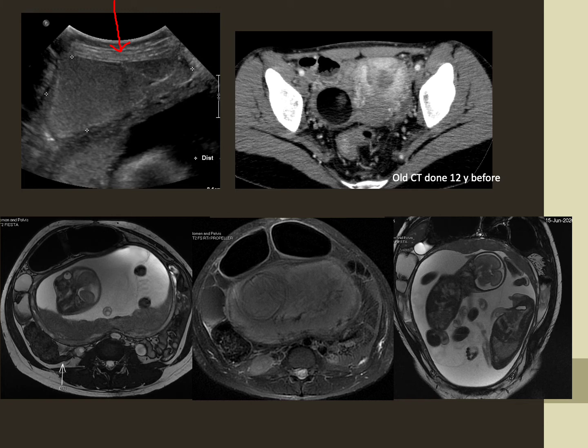However, the question from the clinician was whether she had ovarian torsion or appendicitis. As there were no features of ovarian torsion on the ultrasound or MRI, we had to look for the appendix, in this case, which is shown here, tucked under the uterus in the right flank.